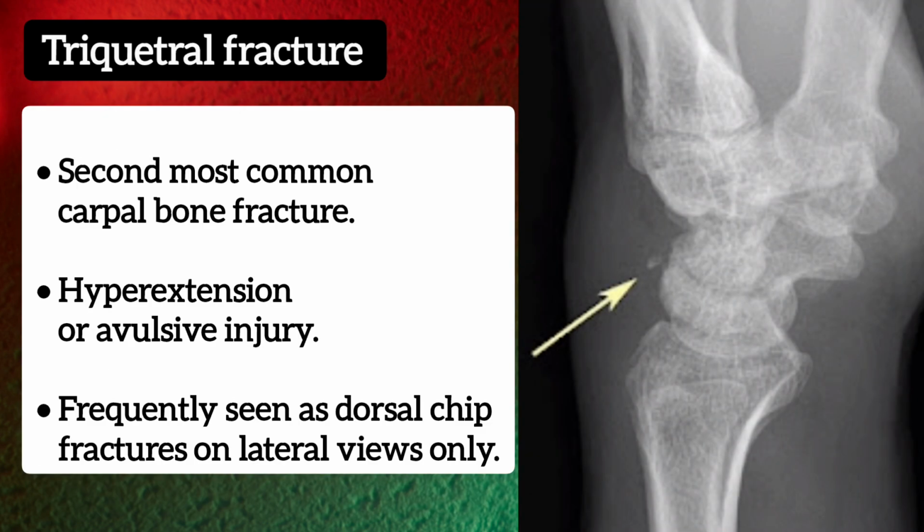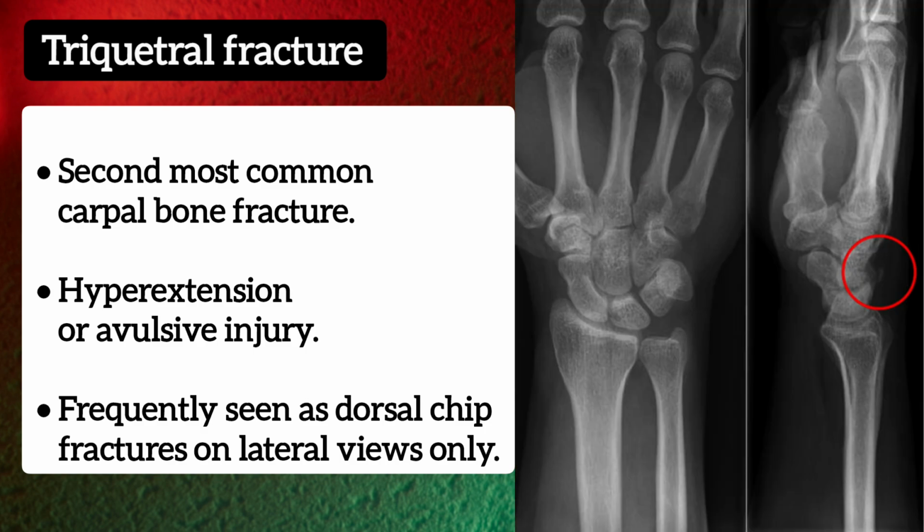Triquetral fracture, second most common carpal bone fracture. Hyperextension or avulsive injury, frequently seen as dorsal chip fractures on lateral views only.